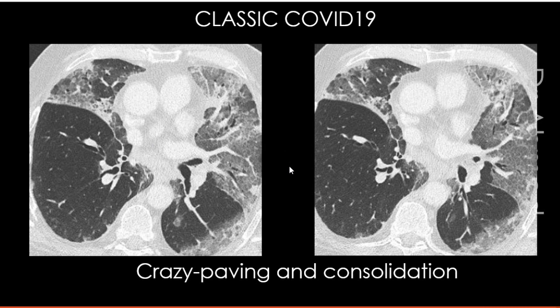What is meant by ground glass? We have 2 opacities in high resolution CT, either ground glass or consolidation opacity. Both make whiteness in high resolution lung CT.